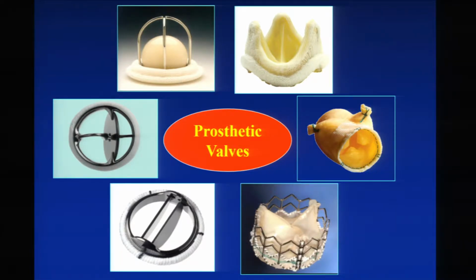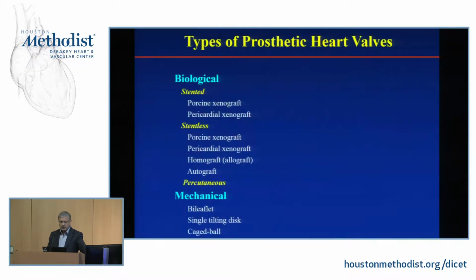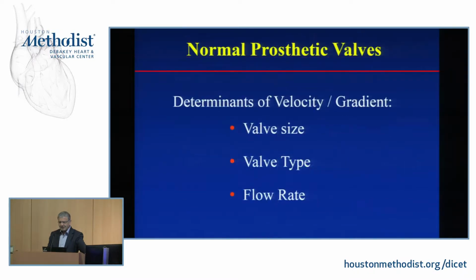So milder stenosis, maybe compared to others, and Mike already has shared with you that the performance of these percutaneous valves is really quite impressive, actually better than we've ever seen with prosthetic valves, looking at these gradients and these velocities. So yes, we have a challenge. We have all these different kinds of valves, and you just figure out the number of models and sizes and everything else.